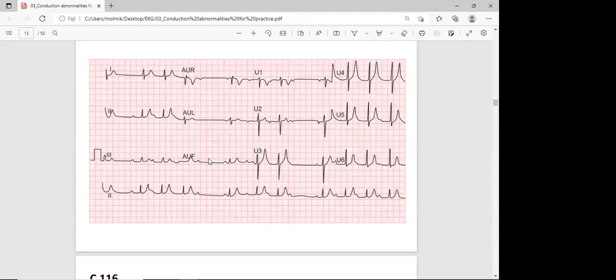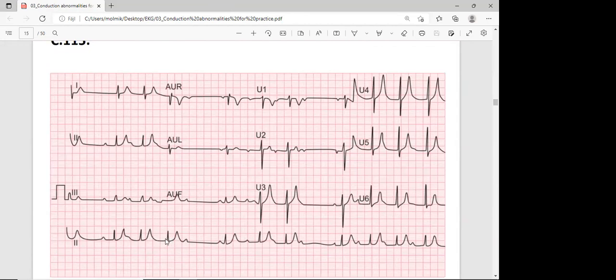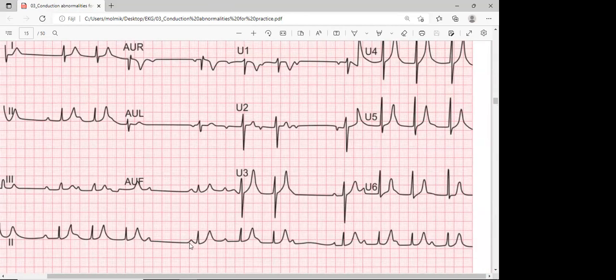I'm sorry, about looking at just the P waves, how do you differentiate between type 1 and type 2? Only the P wave? Yeah. Very simple. Where you have no conduction, this is conducted, this is conducted. Now here it's very difficult to see the P, but here you do see the P, because on the ST, somewhere here.